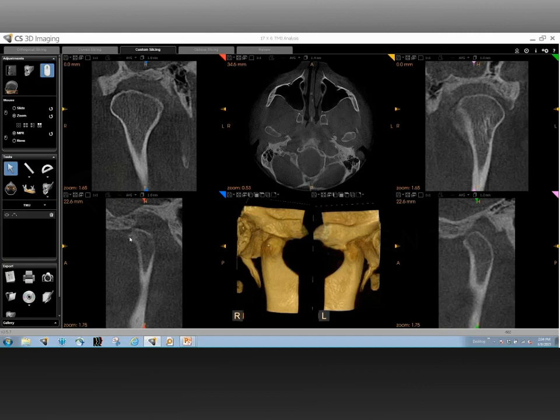Now, what do we typically look for in these things? We look at the smoothness of the surface, the smoothness of the structure of the condyle. We look at the smoothness of the articular fossa and any other changes. You also see a little bit posteriorly some mastoid air cells, as I'm pointing out right over here. These are the mastoid processes in which mastoid air cells exist.